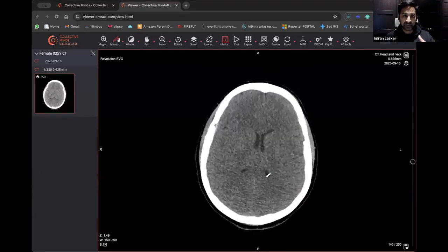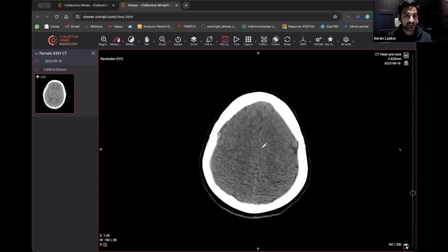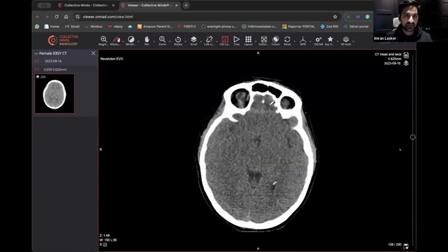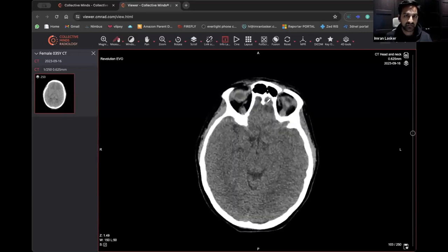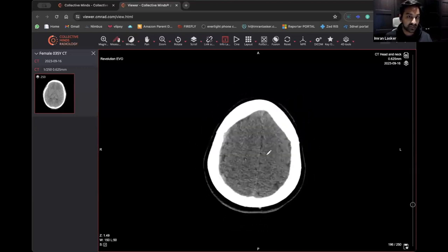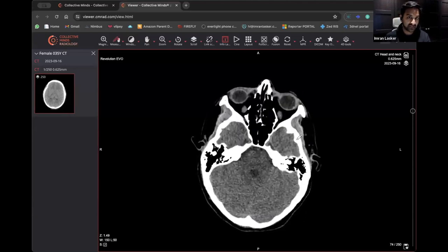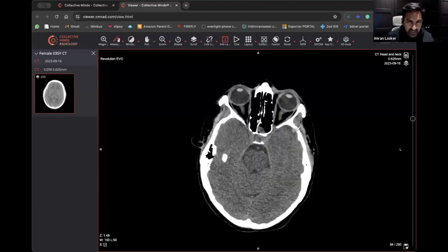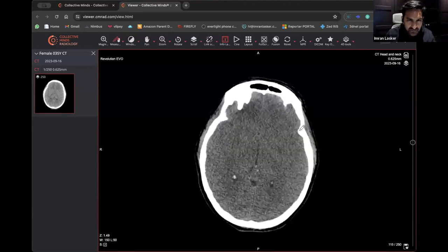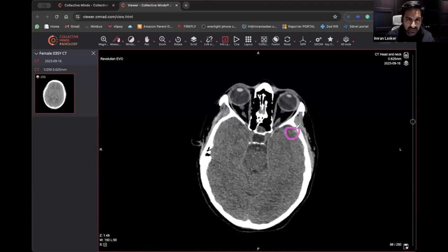So on first glance, when you go through it, you may not entirely see everything so quickly. But actually, when you look at it again now, you can see up there's a contusion bleed there, a contusion there, maybe some contusion over here, just there and there. And then you start looking around here, you saw that subdural hematoma on the right. And when you take a closer look at that temporal lobe, which is a very common area to get bleeds, I think there could be a small bleed there. And actually, come to think of it, that might be a contusion bleed as well, rather than a subdural that I initially had said. And the reason I say that is because there's a bit of low parenchymal density around there.